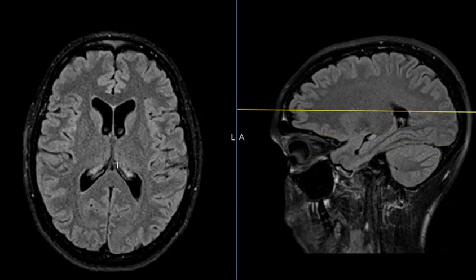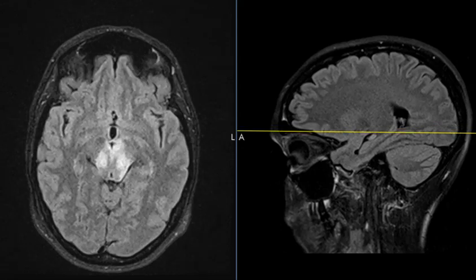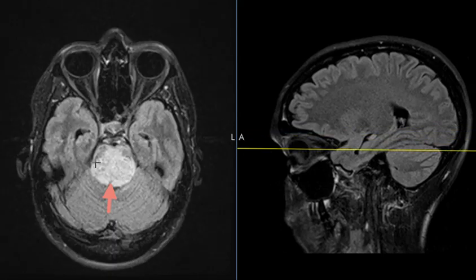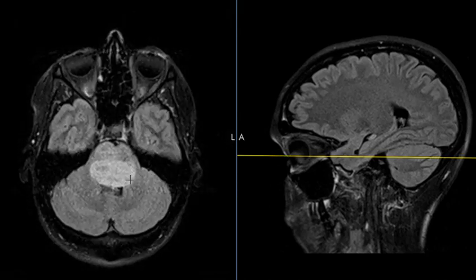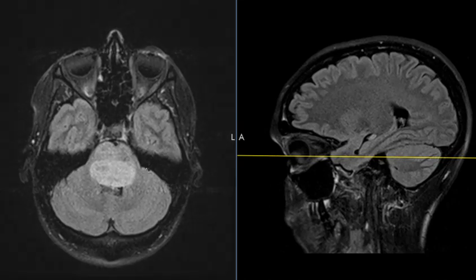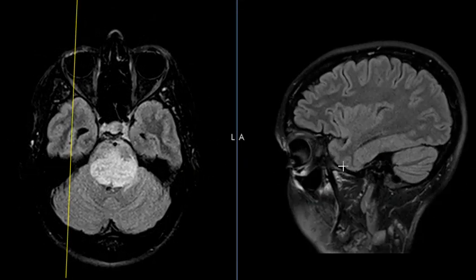The ventricles fill with fluid here. These are not dilated, so it's not obstructing that fourth ventricle. So a mildly expansile, diffusely infiltrative process. And the question is, what is this? Is this tumor or infection or multiple sclerosis? And the truth is we cannot tell.